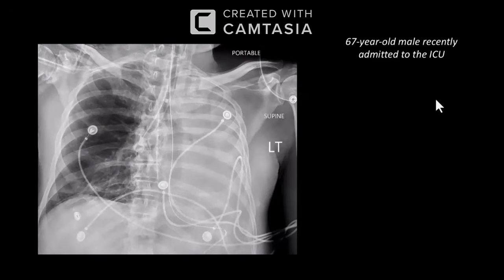So this is misplaced. The gross abnormality otherwise I can see is almost complete opacification of the left-sided hemithorax with ipsilateral pull of the cardiac and mediastinal shift. I cannot appreciate any gross mass lesion. There are no associated rib erosions.